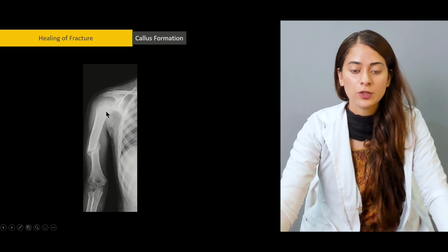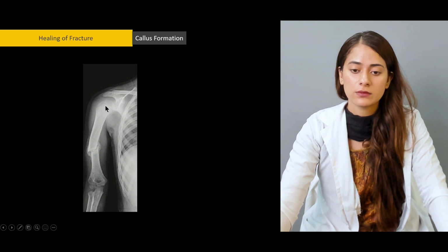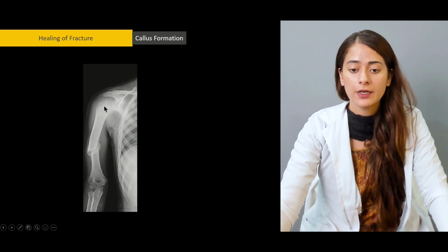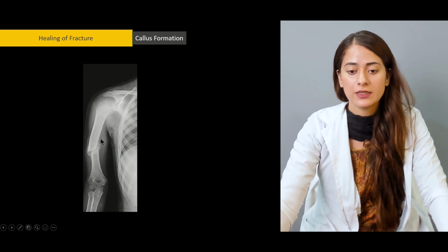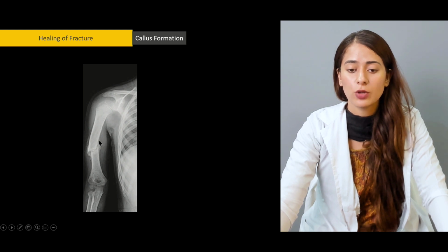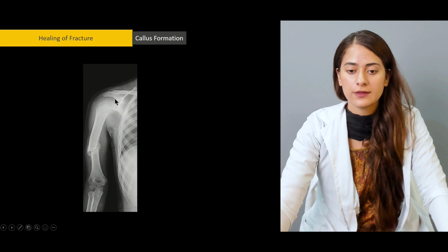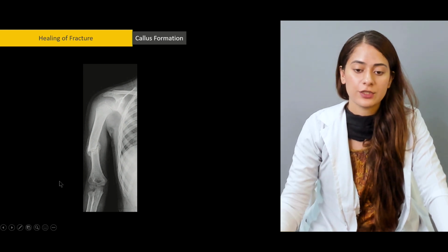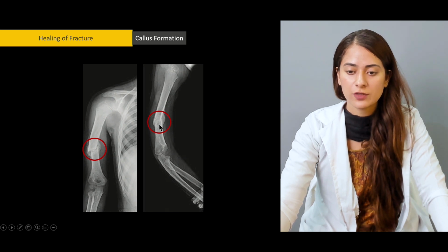Basically the bones do not let any X-rays pass through, and thus this appears very white, or as you would say, very opaque. And this here lets some of the X-rays pass through and blocks some. So this appears a grayish color, and this is a very visible whitish color. Here too, this is the callus formation, which is a fibrous cartilage.